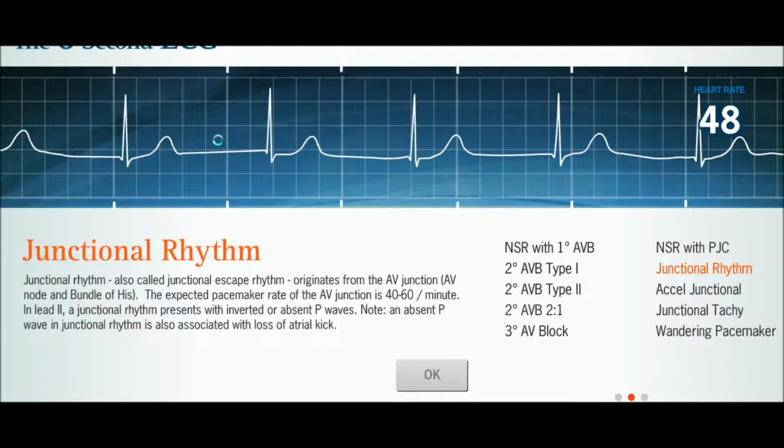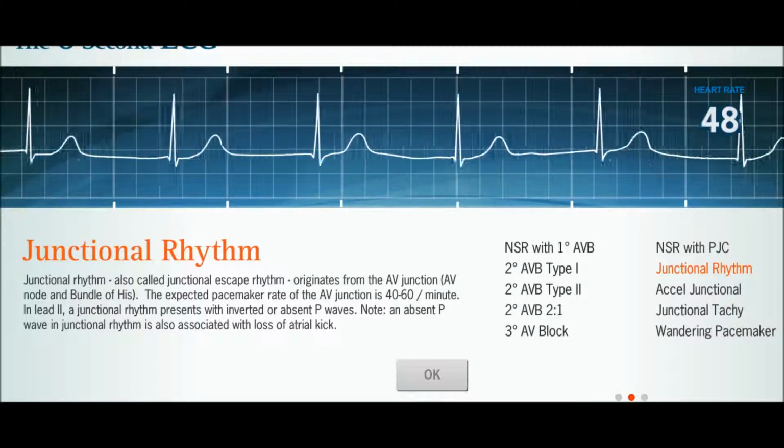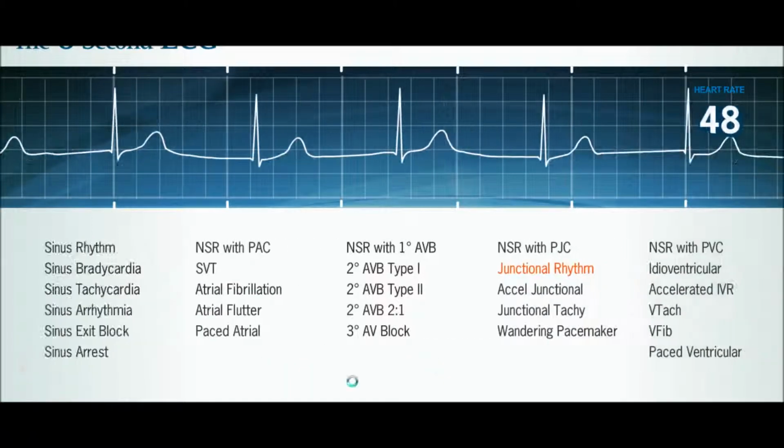But we don't have P waves in this situation. That's normal. It really depends on your patient in that situation. So yeah, this is a junctional rhythm. All right, now let's go to the next one.